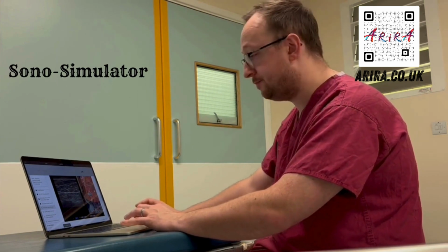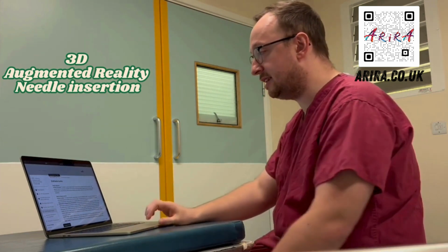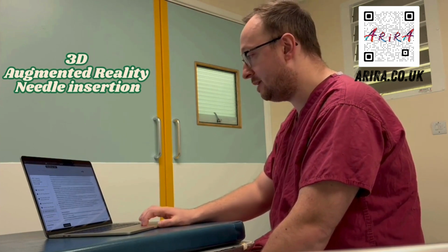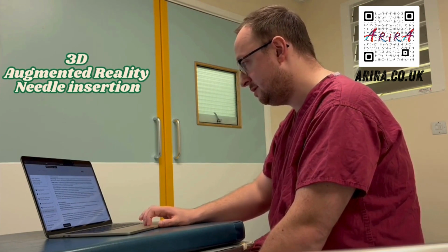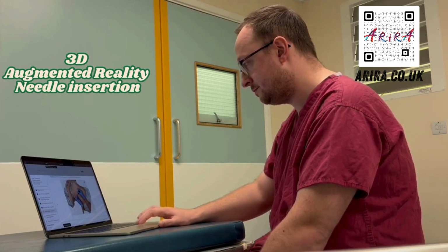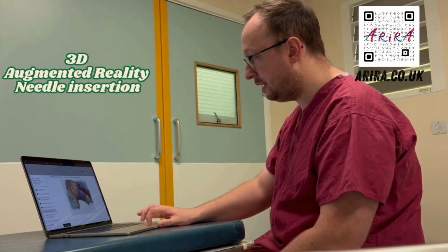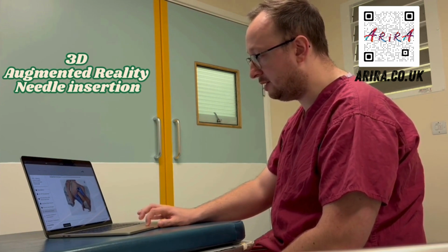regional block teaching platforms. And this is all about needle insertion technique as well. Obviously, that's probably one of the really important parts of any kind of regional anaesthetic technique, visualising your needle properly, the direction, the path, where you're aiming your needle to go. And this talks about all of those things here. Again, we've got a 3D model here that you can also click on the augmented reality to use your phone for. And you can adjust on the screen here, looking at the positioning of the needle, the angle, where the probe's being held as well.